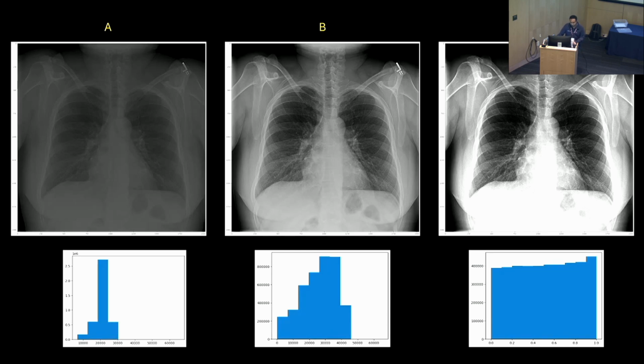So a histogram is a distribution of the intensities, right? On the x-axis is the intensity of the pixels, and on the y-axis is how many pixels are of that intensity. This image here is obviously very dark, so no pixels of the brighter intensity. Higher intensity for us is whiter, right? And then middle, and then at the end, a relatively even distribution for all intensities.